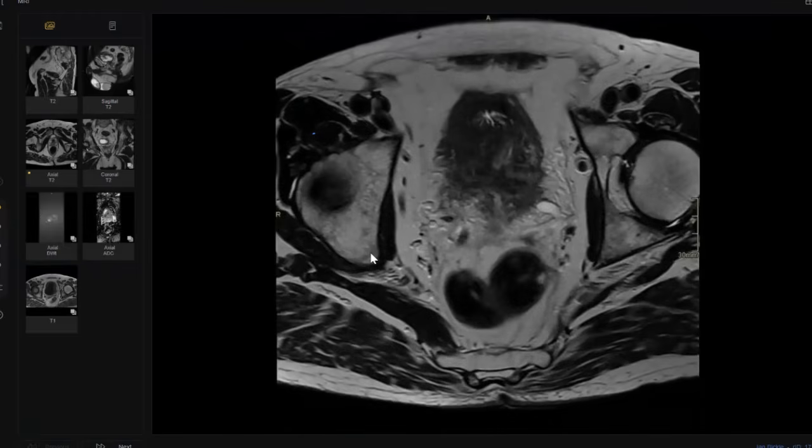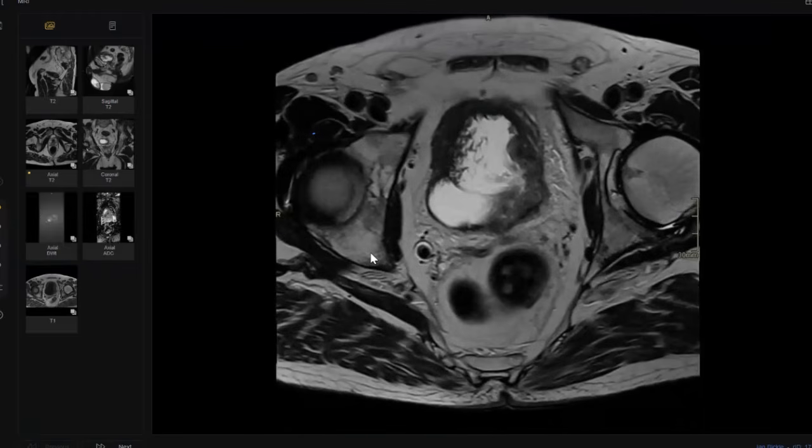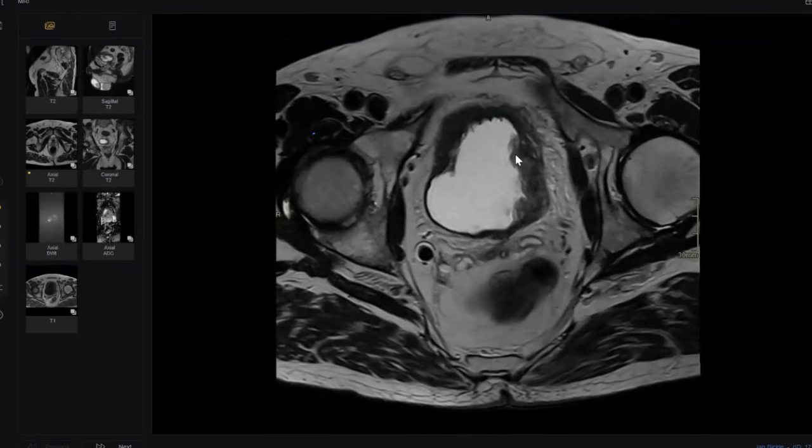When you are searching in something like this, you finish the bladder. Very clear, there is mural thickening, or there is a mural mass, with a signal that is totally different from the muscles. The muscle here is dark because we are in T2. Here it is slightly brighter than this muscle. Okay, so this is a tumor.